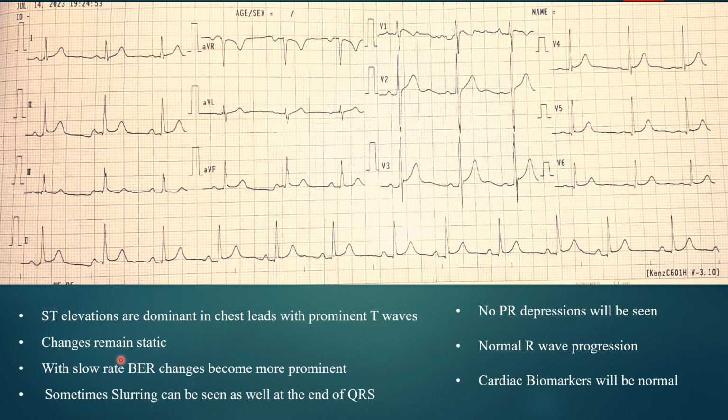And with a slow heart rate, the early repolarization changes become more prominent. So this is very important, especially when you are seeing the patient and doing sequential ECGs. If you happen to see that by any chance the heart rate goes down, these changes usually become predominant.